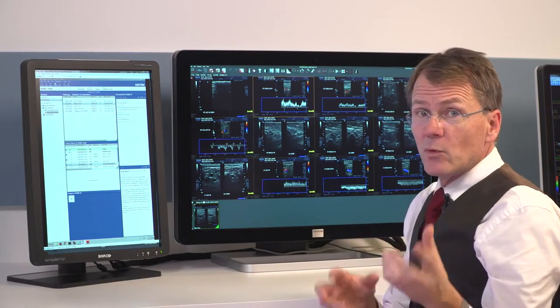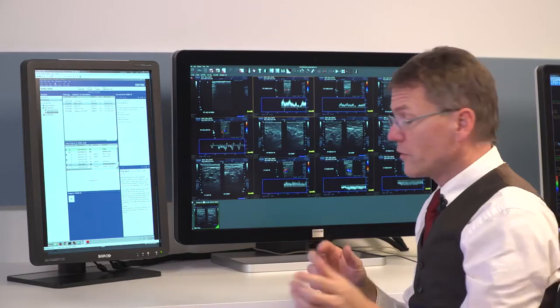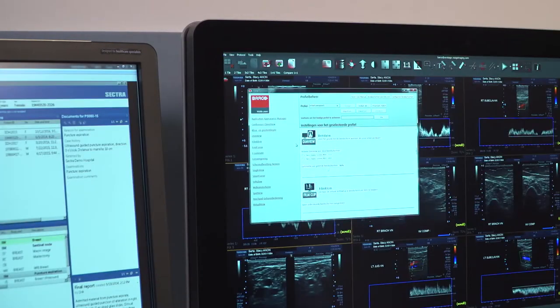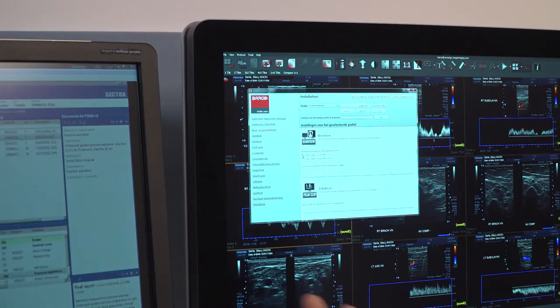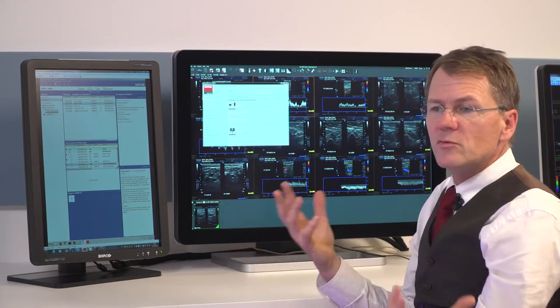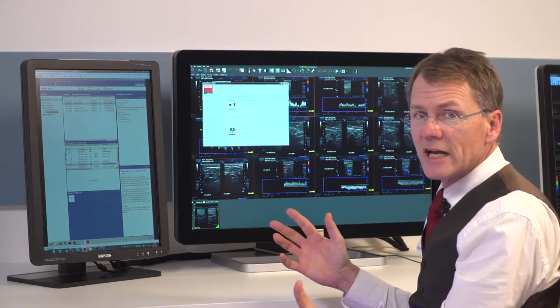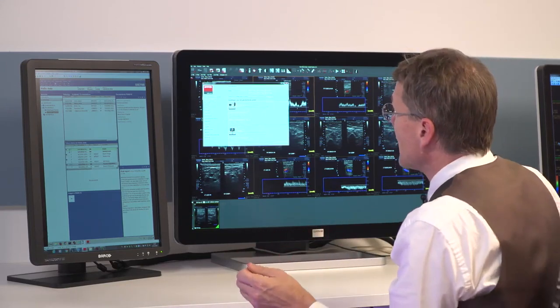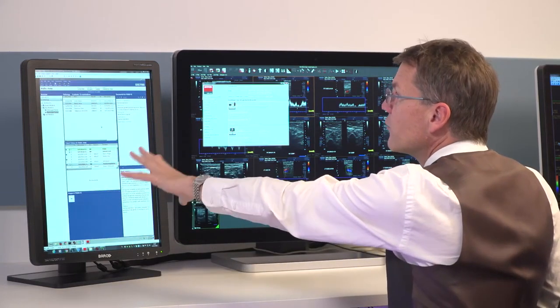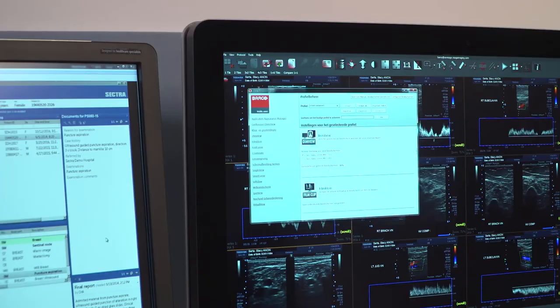So better would be to turn on the DimView feature, which is also found in the control panel. And so here I can turn that on for this display, and now that one is dimmed. And this could be a Barco display, or this could be some other display that's also attached to the MXRT card. And so now when I move the cursor onto this display, it's just as bright as it ever was, and I can see everything on here just fine.